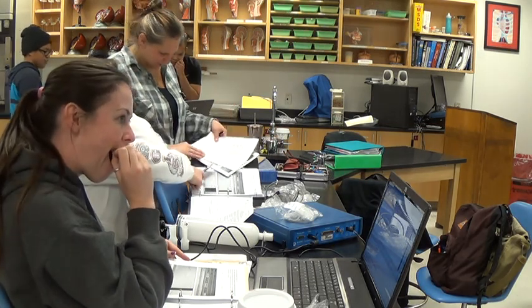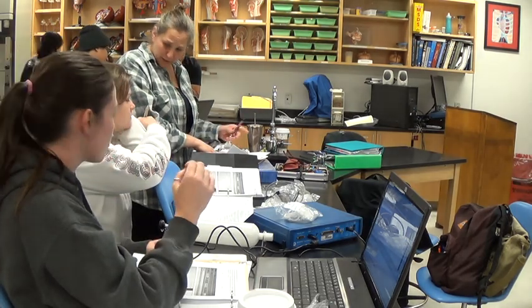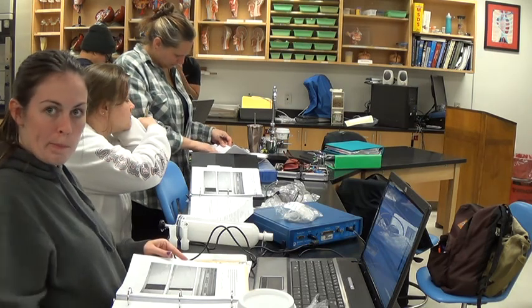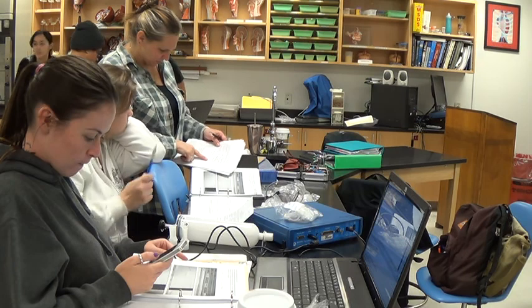Yeah. Okay. 2914. So let me look at your graph. We can figure it out from the graph too. So I divide those to get the percentage.